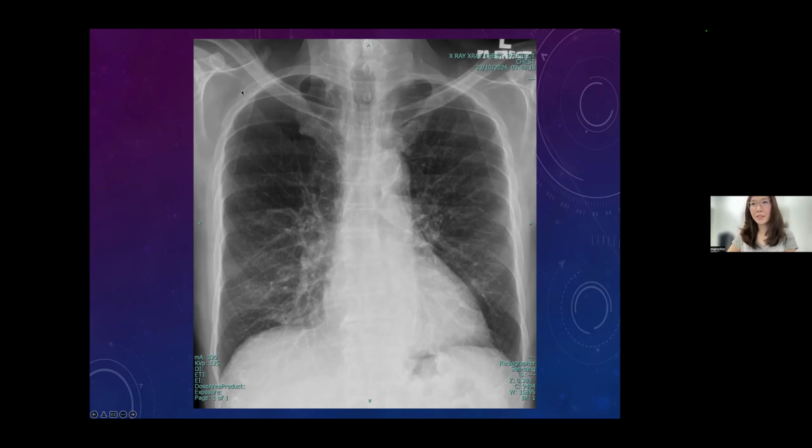Okay, go through the review area again, everyone. Start from apical, any apical pneumothorax? For this case, there are none, right? Yes. We don't see any pleural line, obviously. And then coming down again, the lung fields are fairly symmetrical. This one we already detected on the right side, and the left also has some fibrotic changes. Also, the costophrenic angles on both sides are actually fairly clear. Still sharp, there's no pleural effusion. Retrocardiac is still acceptable because this is a little underpenetrated.